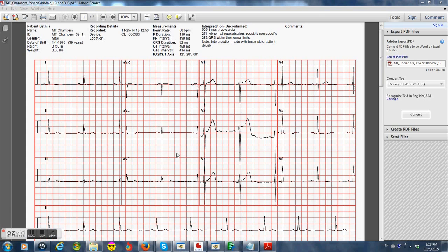We don't know exactly what we have here. We will go ahead though and eventually allow our statistics to help us with determining what the underlying condition is here, just like with the other patients that we've examined so far.